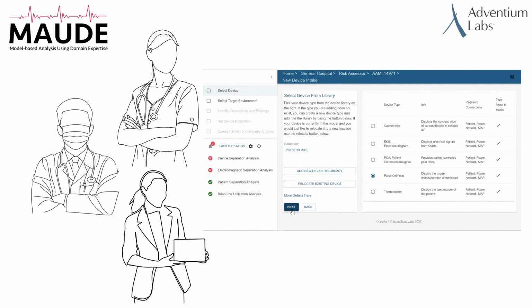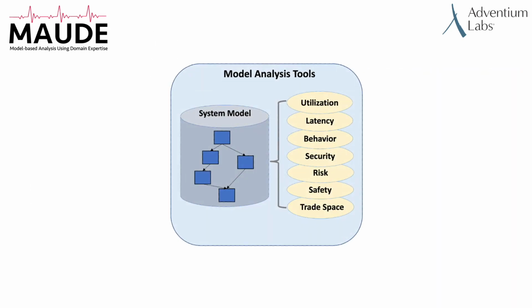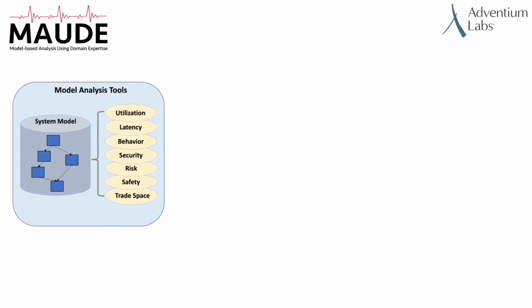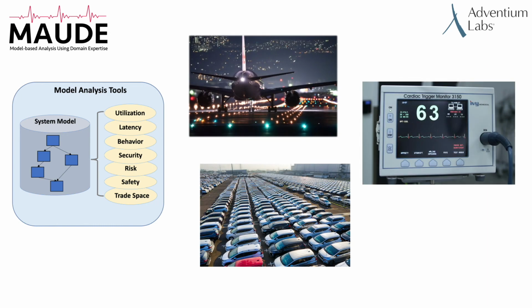These examples show how MAUDE can assist health professionals in tasks like adding devices, setting properties, and performing analysis in a hospital model. Beyond healthcare, the MAUDE infrastructure and user interface supports model-based development and analysis for any setting that involves complex cyber-physical systems. This includes applications such as aerospace, automotive, and medical device development.